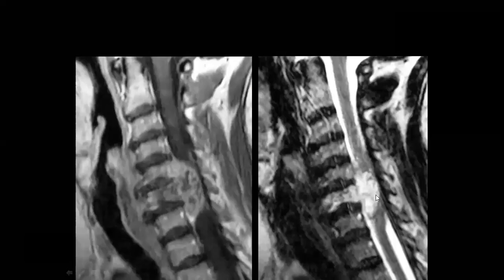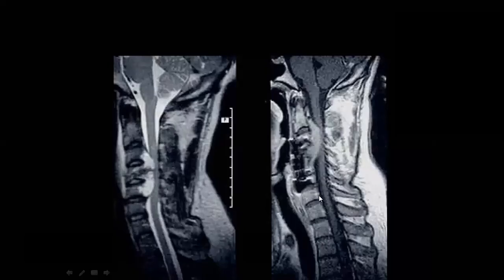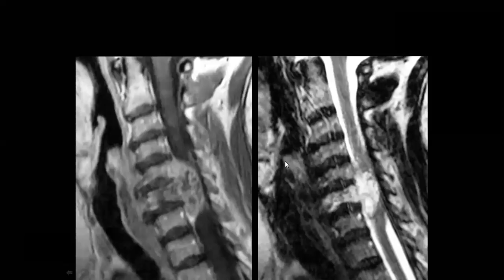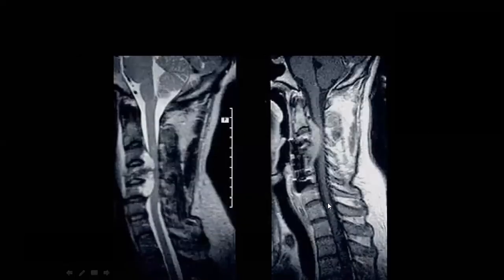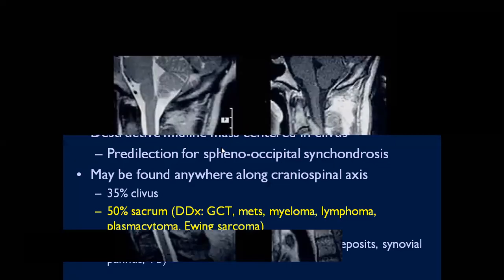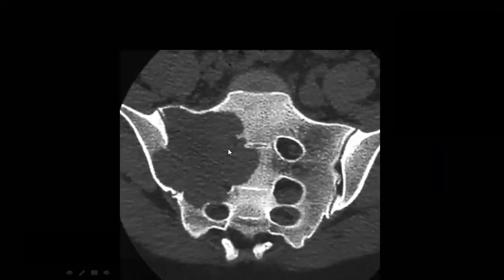So this is again chordoma. It is not common, but it can happen, okay? So put all the differentials, but don't forget cord compression, please, because this is critical for the patient. And if you don't mention it, even in the management, you will lose marks. Okay.